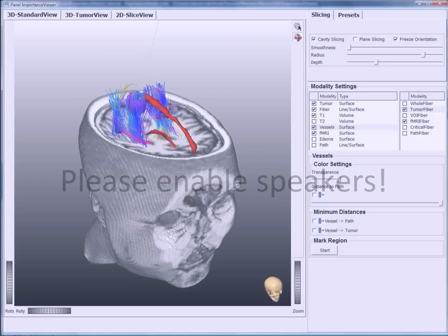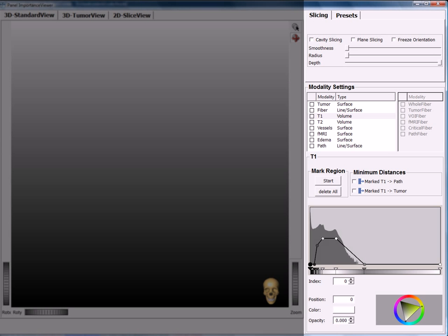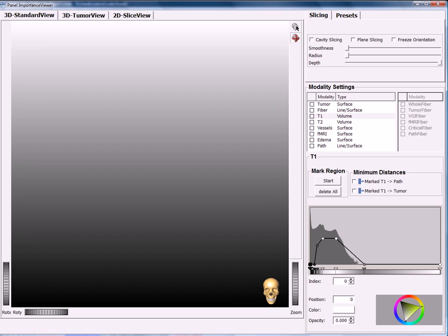This planning tool, implemented as a guide for surgeons before a tumor resection, has a viewport on the left side, which contains a possibility to switch between different view modes as well as a selection mode, which will be described later. On the right-hand side, a slicing panel is implemented, of which the functions will be shown in the next section. Beneath the slicing, a modality list is located, out of which the surgeon can choose the structures of interest. Below the modality list, a panel corresponding to the picked modality is situated and an overview of functions is given.